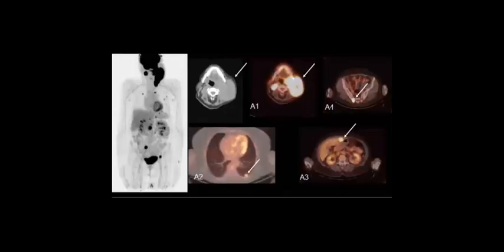Then we try to collect findings and reach something. I know that it will be a bit more difficult than the previous conventional images. Can we try? At least we can try until we become familiar with this image.